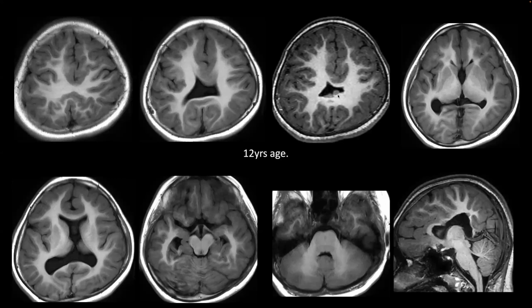There is some degree of gray matter heterotopia along the posterior aspect. The septum pellucidum is hypoplastic, giving an almost box-shaped appearance of the lateral ventricles. The lateral ventricle is dysplastic and dilated. The temporal horns are again slightly abnormal in morphology. On the sagittal sequences, I can only appreciate the genu and the anterior aspect of the body and rostrum. The splenium is maybe thinned out, but the body is definitely not visible.